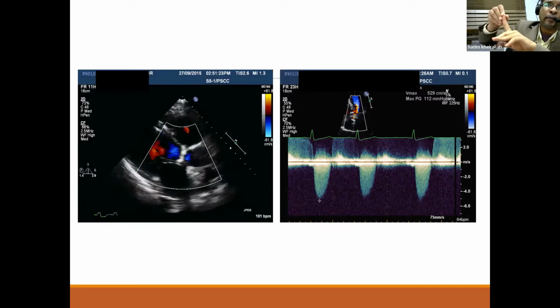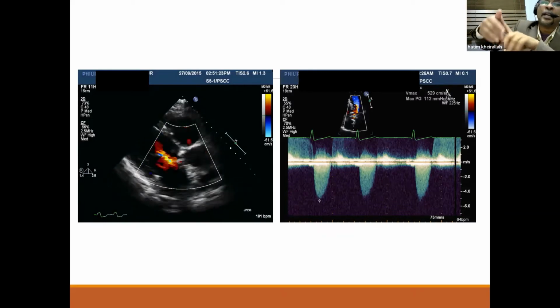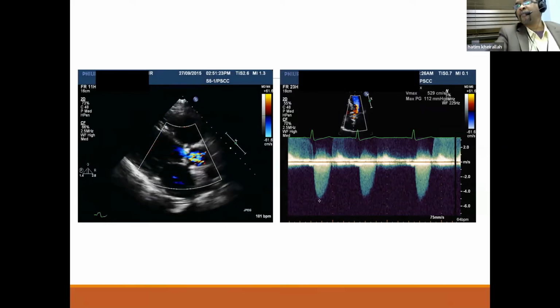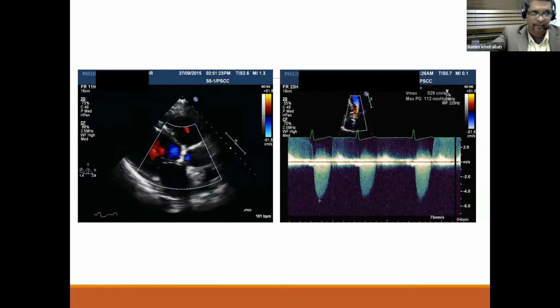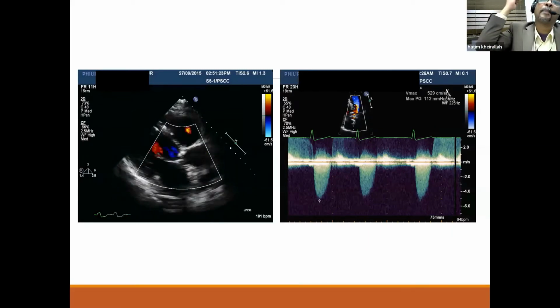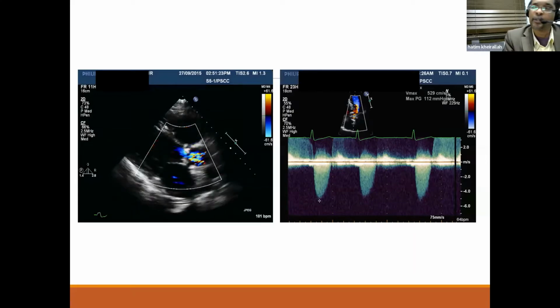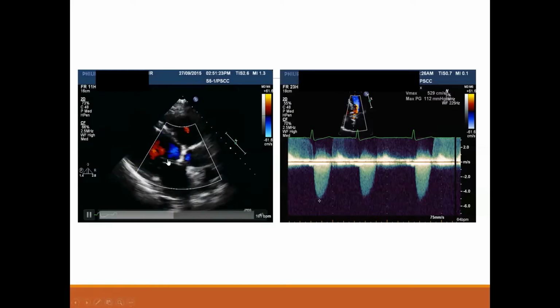In low flow, low ejection fraction, we know we have to do the dobutamine. In normal flow, normal ejection fraction, whatever you get from the gradient is a truthful gradient and you should trust it. But in paradoxical AS, it's low flow, normal ejection fraction. You have to calculate the stroke volume to prove that this is paradoxical aortic stenosis, and do cardiac CT for calcium score estimation.